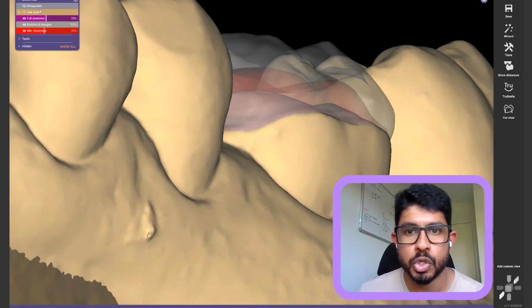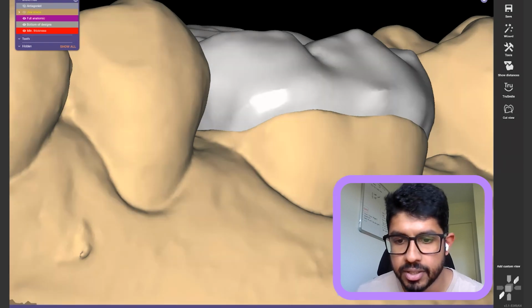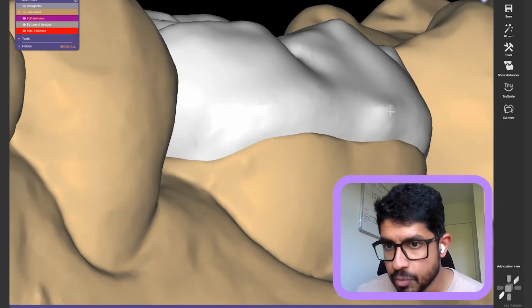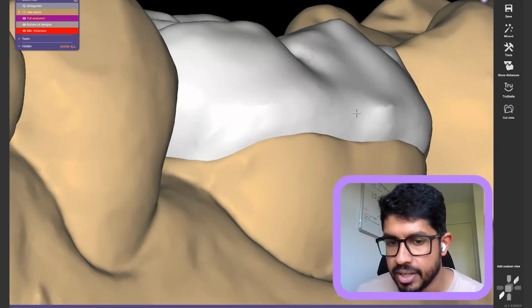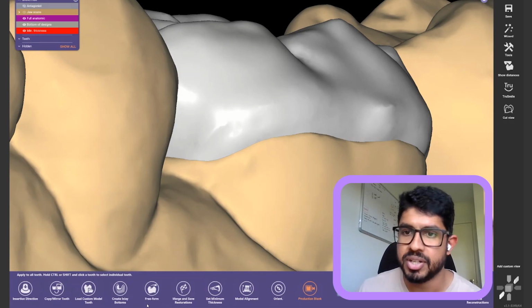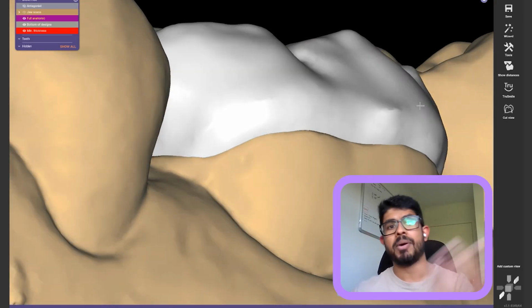Erica, when you were trying to smoothen this before, you would have seen the reds pop up. And actually, I'll show it later. But when those reds pop up and you smoothen it in, when you go to your final step where you're finalizing your restoration, it'll bulk this back up just to fill in. Exactly, good. So that's what bulks it back up.